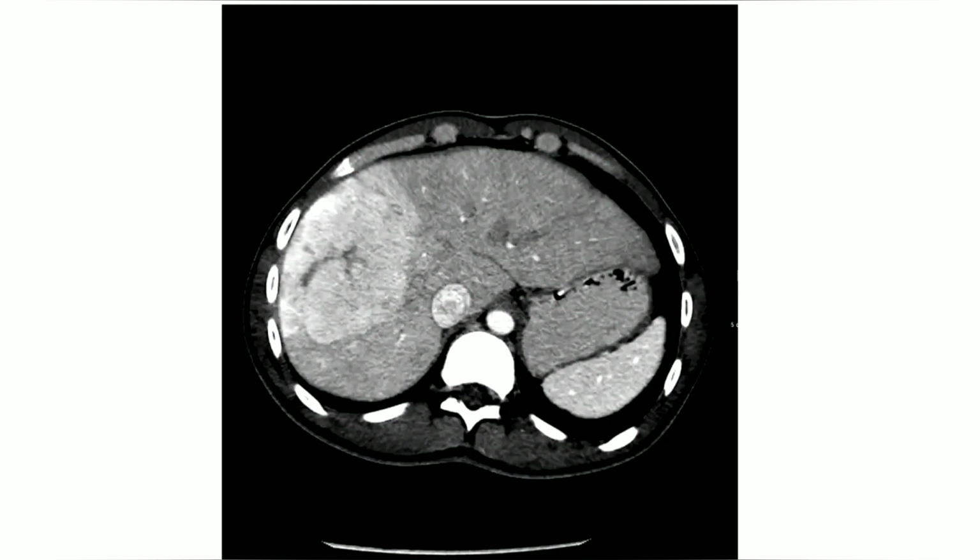Excellent, but I thought that you did not know how to summarize this case because it's only a single phase. See this in practice. This actually came to us as an incidental liver lesion on the CT. The patient was doing a CT abdomen for another reason, and this mass was incidentally found on the CT with single portovenous phase. So always keep your approach simple for liver.